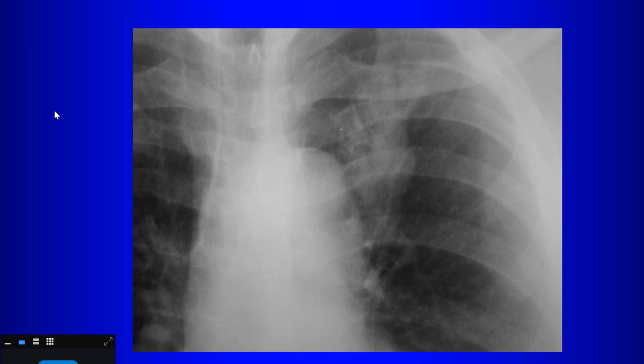What am I showing you here on this chest radiograph? This is the finger and glove sign. Yeah, so there's a branching tubular opacity here, right? So that's a finger and glove sign. What's the significance of the finger and glove sign? What does it mean? Mucoid impaction, right? So this means that there's mucoid impaction here. So give me two benign causes of this and one malignant cause.